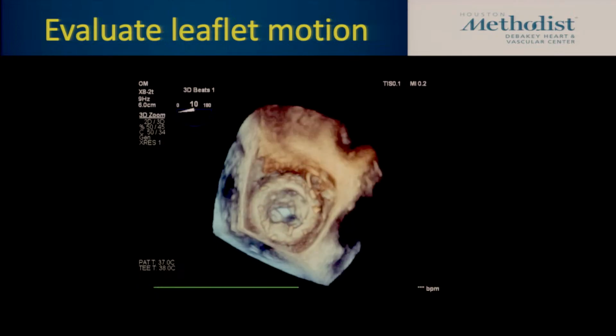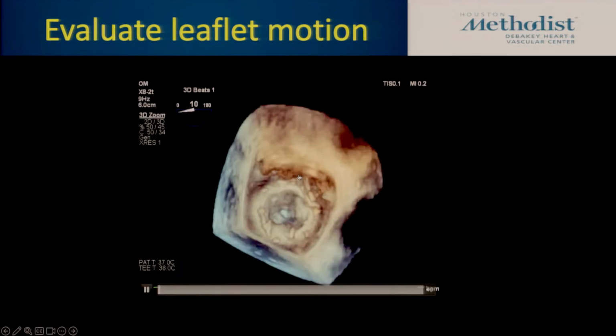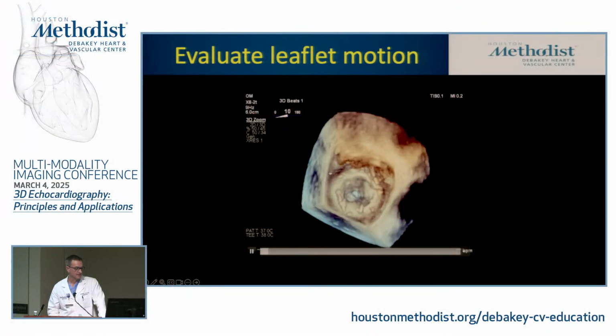That has some implications. One is PVL. PVL tends to be where stitches are. And you also sort of learn your surgeon, if you work in the same place long enough, who does what. But this is a bioprosthetic valve sewn in with interrupted sutures all the way around and clearly becomes stenotic.